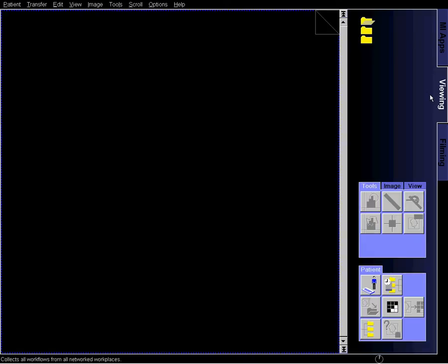What you would need is an additional card down here, which this station does not have, called 3D. 3D is used on most of the SPECT CT scanners and most of the PET CT scanners for fusion. The viewing card is primarily used in the CT realm.